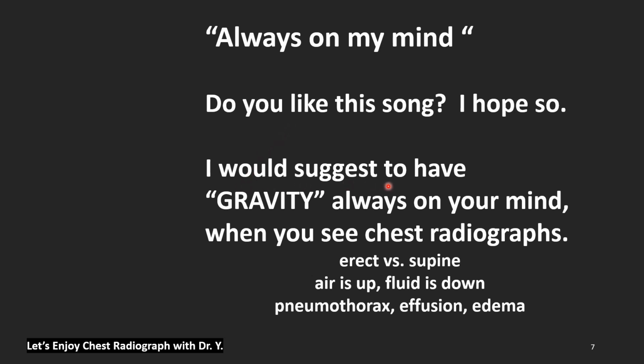I would suggest having gravity always on your mind when you see chest radiographs. As I told you before, in erect film, gravity is toward inferior, but in supine view, gravity is toward the posterior portion of the body. So air is up, fluid is down, because fluid is heavier than air. In pneumothorax, pleural effusion, and pulmonary edema, this gravity is important.